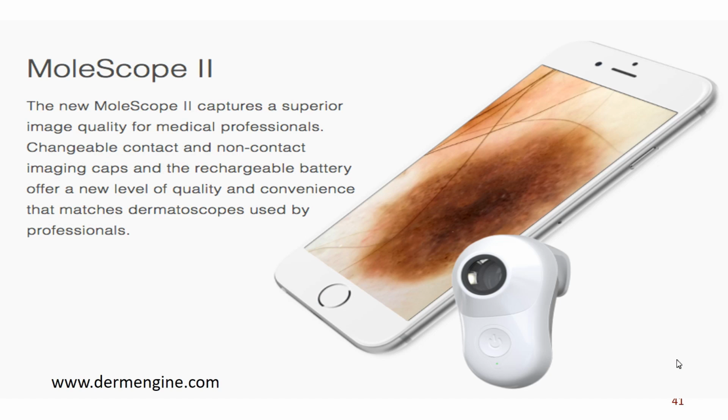So my current number one favourite is the Molescope 2, which is a device that's polarized. Emily has Molescope 1 in her left hand, and she has Molescope 2 in her right hand. The Molescope 1 is unpolarized, the Molescope 2 is polarized. With the Molescope 2, you can take off the front, you just remove it, put your nail under it. It just slips off and becomes a non-contact device. You put a different thing on it.